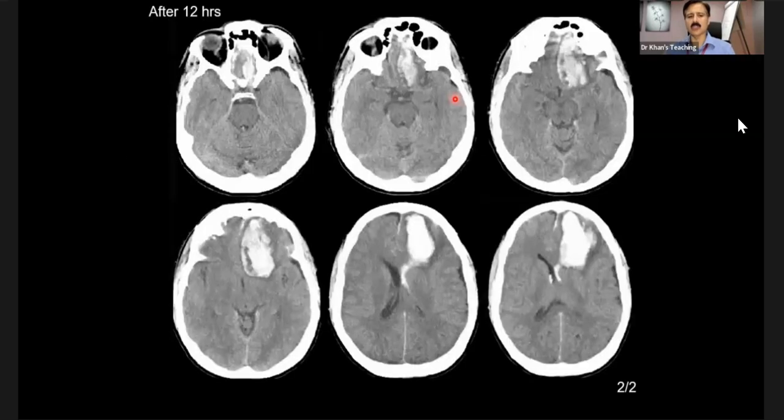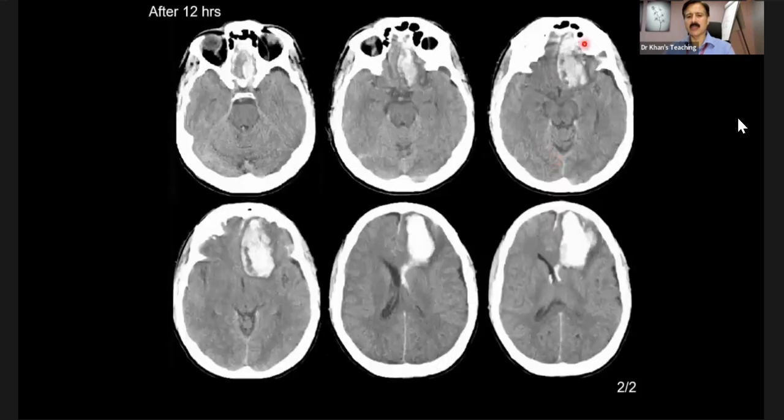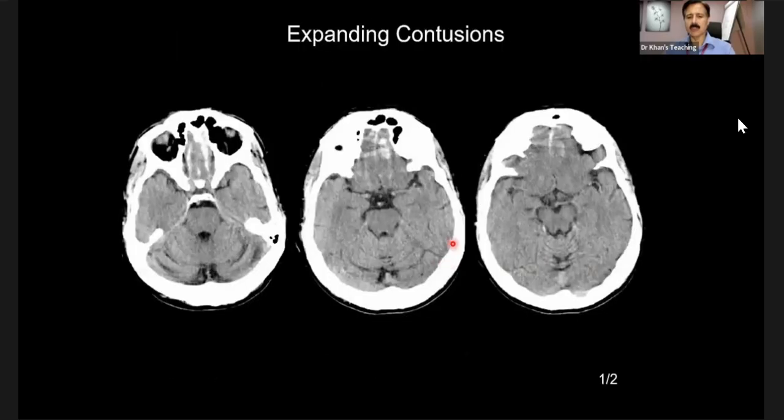So remember this concept. This patient, after 12 hours, had a subcortical, subfrontal contusion, and then it has become such a large parenchymal hematoma that it goes into the ventricle. Please also remember that this case, or a similar case, has come in the exam quite a few times. They will show you subtle frontal contusions because of anatomy, because it is just next to the base of skull. There might be artifacts there. It might be a subtle finding, and you are going to miss it.